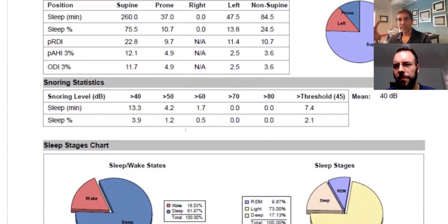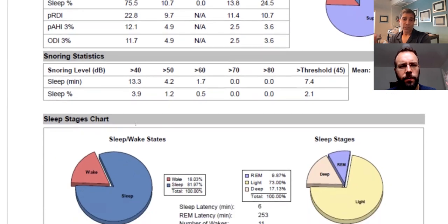The insurance world is just clamping. There's less time for everything. I'd be shocked if any of the doctors doing the WatchPAT even looks at it with this depth, unless they somehow have a lot of time. But I do, because I get 2 hours with each patient, so I go over everything. But anyway, 1.7, that's not bad. That's not that much, right?